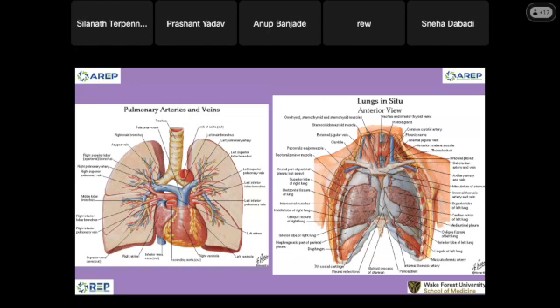And again, you can follow three branches of the aortic arch. This is the innominate artery on the right, then the left common carotid, and then the left subclavian. So all three are here. Now the internal jugular vein joins the subclavian vein and becomes the brachiocephalic vein. The left brachiocephalic vein is coming across the midline, and it will join the right brachiocephalic vein. On the right, it's the same: the internal jugular vein joins the subclavian vein and becomes the right brachiocephalic vein.